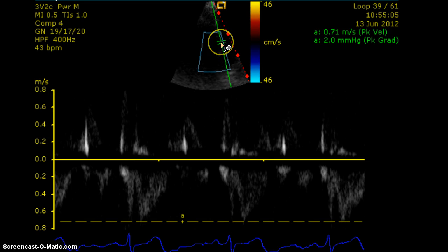What's going on? So again, recommendation would be clean up your 2D color image prior to placing Doppler and make sure that your crosshair is in the correct location.